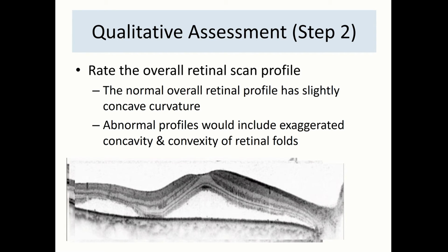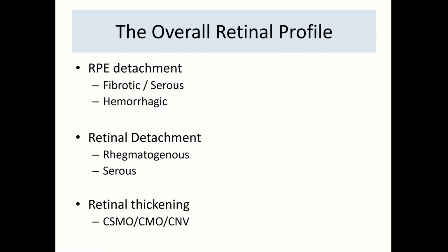Here you can see this is the area in which you see the first black band. This is the retinal pigment epithelium if you're looking from behind. And then you've got this whitish line which you see is the subretinal fluid, and there's another one over here. So there are two fluid areas in the subretinal space with intact inner retinal layers. So this is a patient with central serous retinopathy.